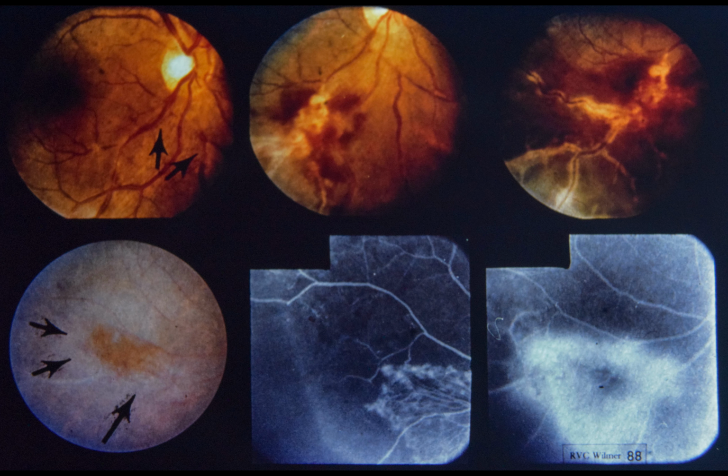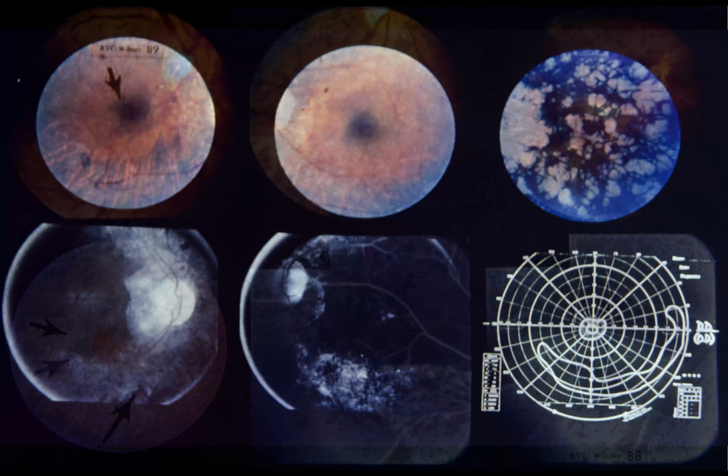Comment: This case demonstrates that in patients with sarcoidosis, vascular inflammation may lead to obliterative changes. When retinal non-perfusion is extensive, secondary neovascularization may develop, as in other proliferative retinopathies. In an effort to prevent vitreous hemorrhage, patients with sarcoid and retinal neovascularization may be candidates for photocoagulation treatment.